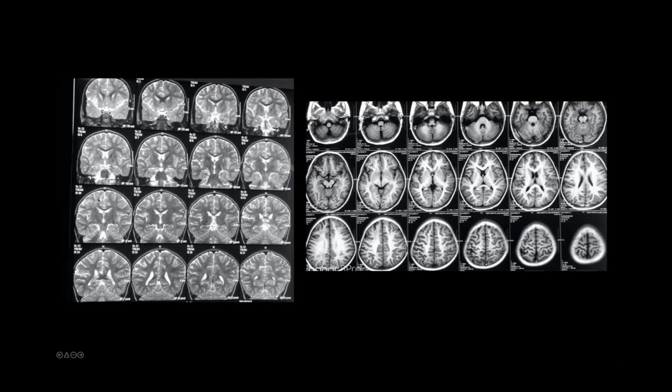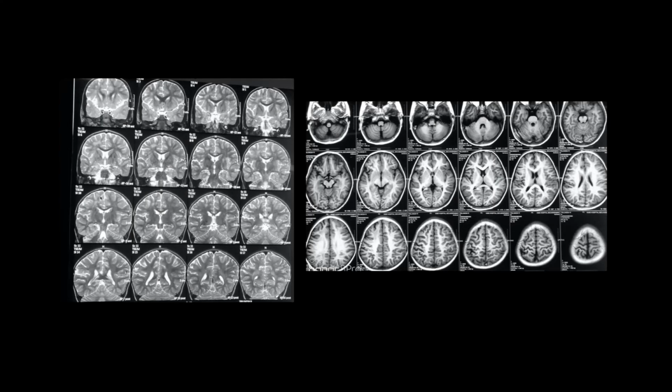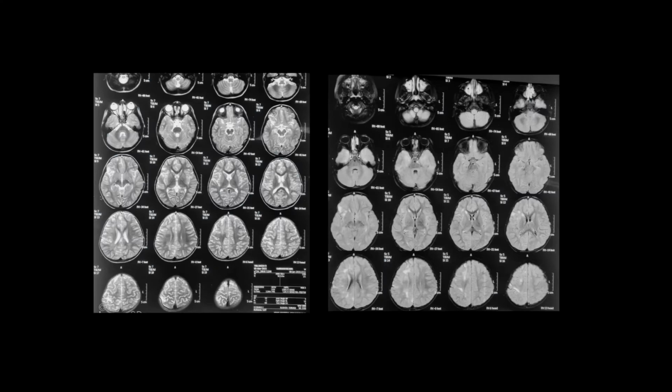Coronal images again show similar changes to those seen on the axials: predominant involvement of the right cerebral white matter and also the gray matter involving the cortex, with some asymmetrical atrophy of the frontal regions. I don't know what Dr. Mankad or anyone else would think, but I would not think that these are changes related to hypoxia or hypotension, at least in the neonatal age group. Whether we're dealing with demyelination or an infection was the doubt on the images. And the question was whether the atrophy, if the patient has right focal epilepsy, is related to the epileptic discharges or not.